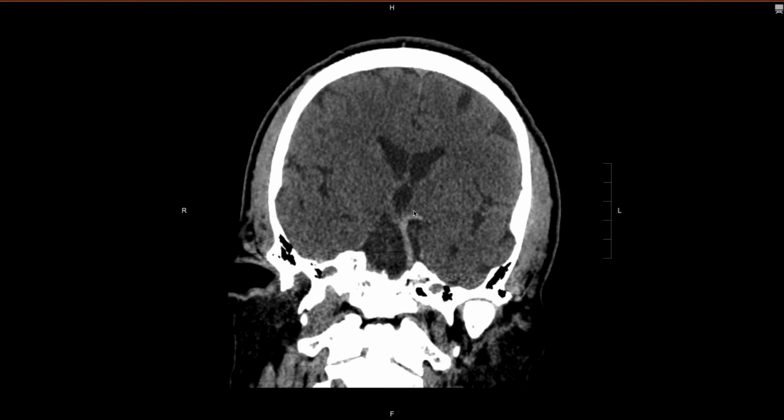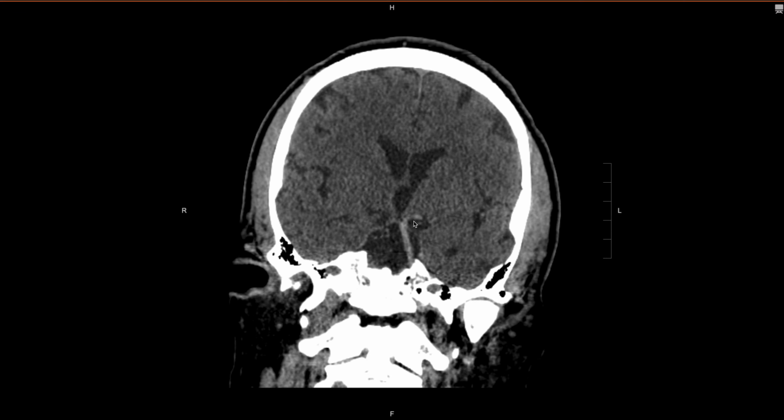Now, that being said, if the patient really doesn't have any neurologic symptoms, there's no clinical concern for stroke, it is always possible that it's just a dense looking vessel and it's not actually a thrombus. But you need to actually make the call and talk to someone who has examined the patient and evaluated them before you can blow something like this off.